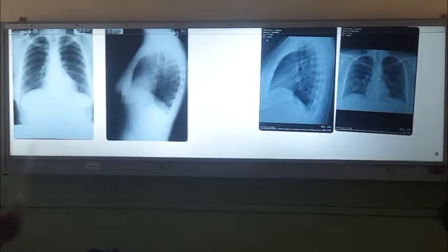So you will see bilateral opacities and all because of the congested vessels. Ideally the patient is not having any inflammatory change, but you are thinking of inflammatory shadows because of underinflation. And the cardiac contour might get altered, so you might think of cardiomegaly also, right? So X-rays should be done in deep inspiration.